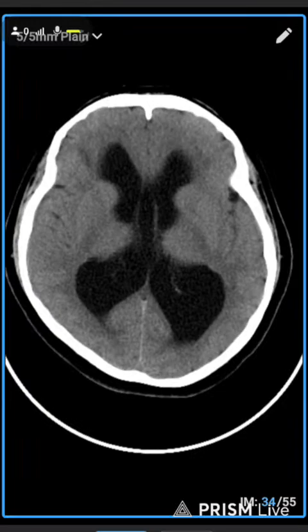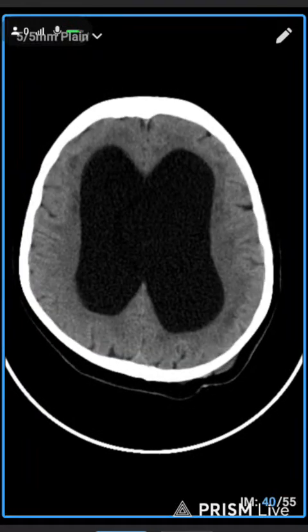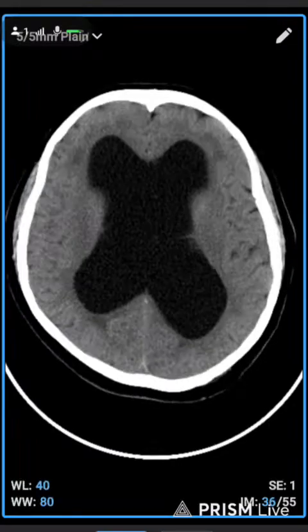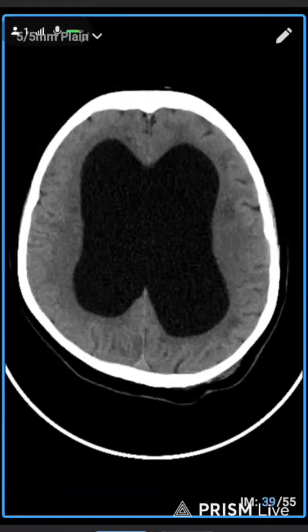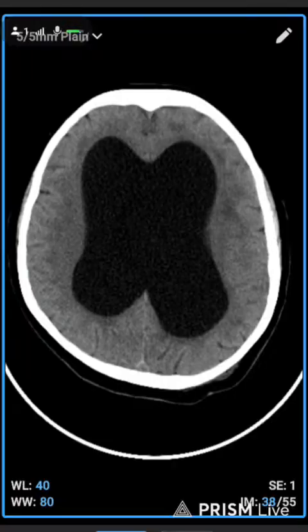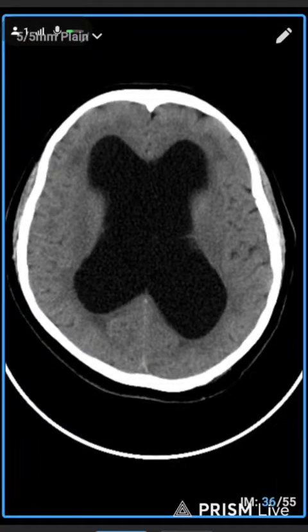In that area there was a block, stenosis, or there may be some other reason, but mainly this is the main reason. It's called the cerebral aqueduct. I will show the cerebral aqueduct.